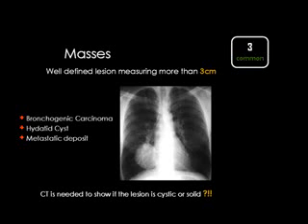Then I will let you suggest the nodule number 7 in this list, considering that the nodule you will suggest should be as frequent as to be seen once per year. The nodule you will suggest should be frequently seen in clinical practice at the rate of once per year. If this nodule is seen at the rate of 1 per year, then I have to consider it, and I have to put it into the differential diagnosis and try to separate it from the rest.